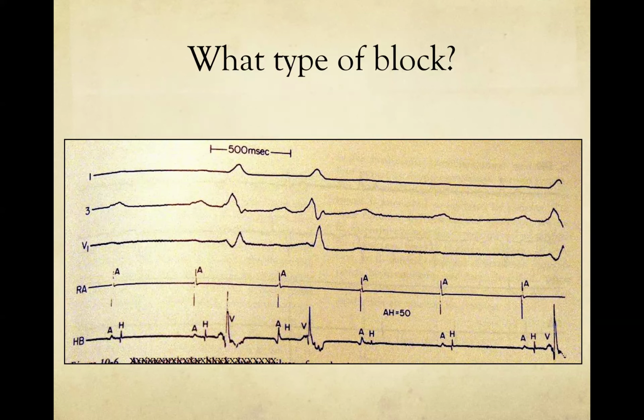If you were to do an EP study on that patient who had heart block or intermittent heart block, and as you said, we're waiting our 7 to 10 days. So now let's say we're at 10 days out. We're not 100% sure. We're still seeing some conduction. What should we do? If you were to do an EP study, most of the time what you would see is something exactly like what's on this tracing, which is infraHissian block. InfraHissian block is considered a higher degree of block, and a more dangerous form of block.